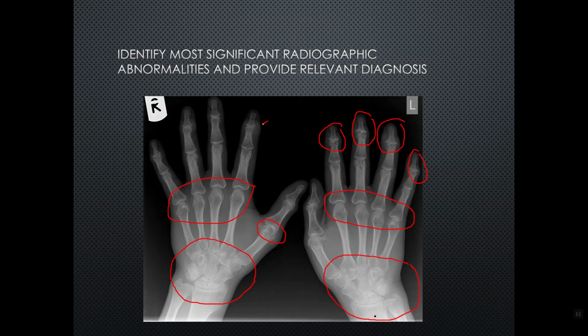And typically what you can see is erosion and cartilage destruction, but at the same time you can see bone proliferation right there. And that's basically that characteristic mouse ears deformity. In other words, periostitis, or subperiosteal new bone formation following the erosion. So in other words, you can have that inflammatory proliferation, hyperplasia of the synovial tissue, and at the same time, enthesitis, which will lead to bone whiskering, proliferation, subperiosteal bone. In fact, if anything, there's subperiosteal new bone formation, increased sclerosis in that bone, certainly marked, can be well demonstrated.